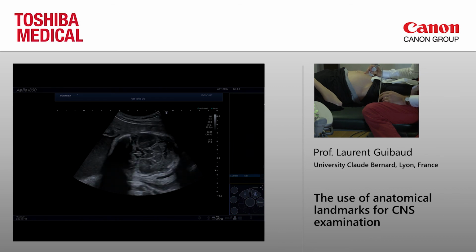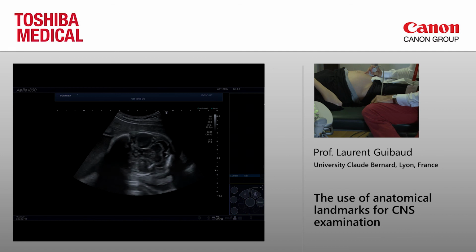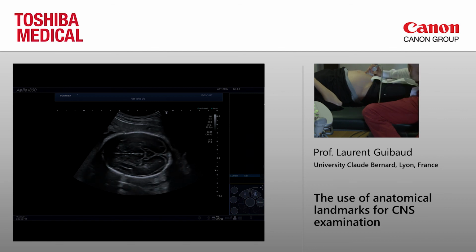You see, in that case, the subarachnoid spaces are really large, and because of that, you see something which is not always seen. What is that and that? You know, there are two round structures. I will show you this. You see? It's a chiasma, yes, and you see the two optic nerves coming here and joining at the chiasma. You see how fine is the image in that case? So on the axial plane, do you have any question?